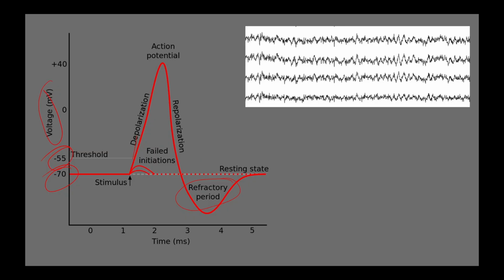So this is how typical EEG signals look. The raw EEG signal is continuous. It is characterized by rhythmic synchronized oscillation. We sometimes call them brain waves; in simple terms, brain waves. You see these are different channels.